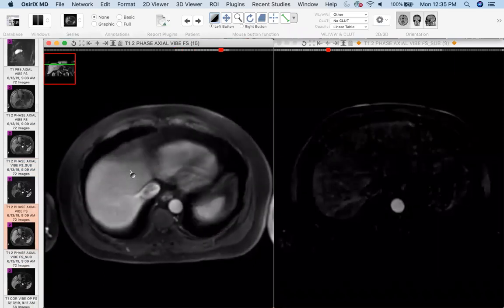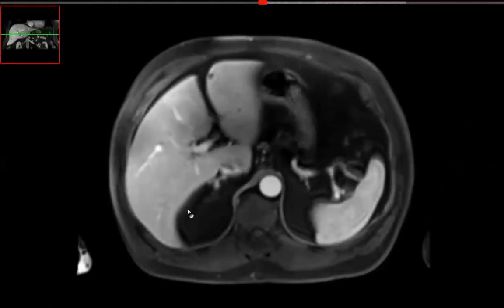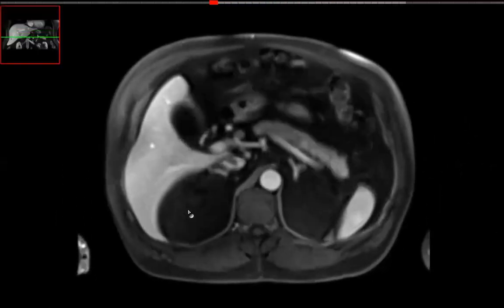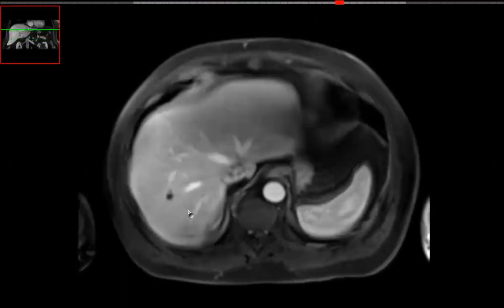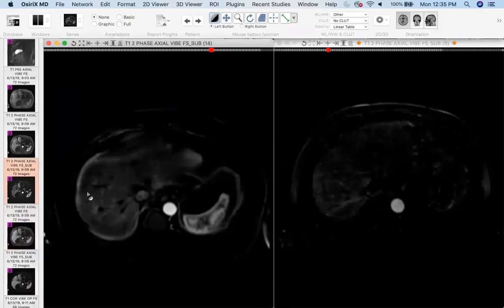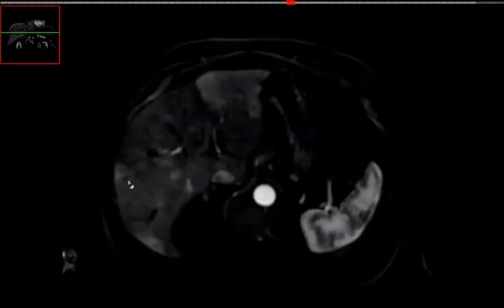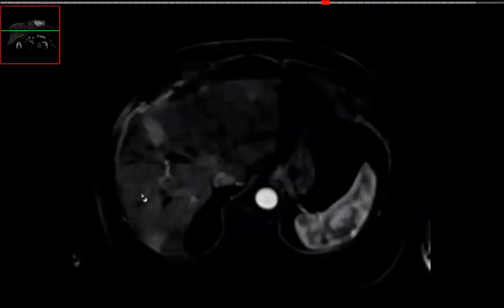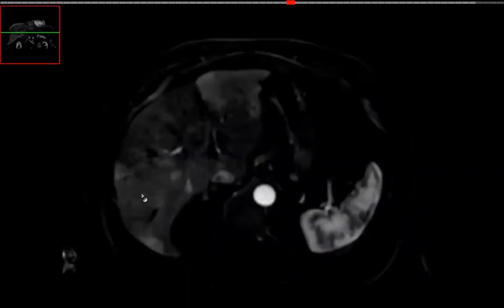I mean, the peripheral, mostly wedge shaped lesions enhance in the arterial phase, and then they become isointense, or isodense if you're using CT. It's pretty classic. But when they're rounded, they can really mimic little lesions, and they look scary, right? Because there's central non-enhancement, so I can see why my colleague gave a really broad differential.